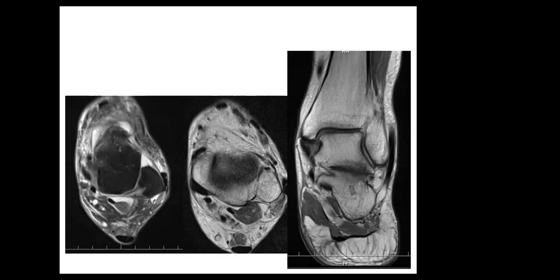There is mild to moderate joint effusion with a fluid collection around the tendon. Peroneus longus, I think, tendon.